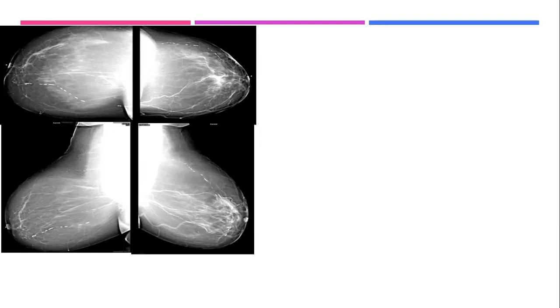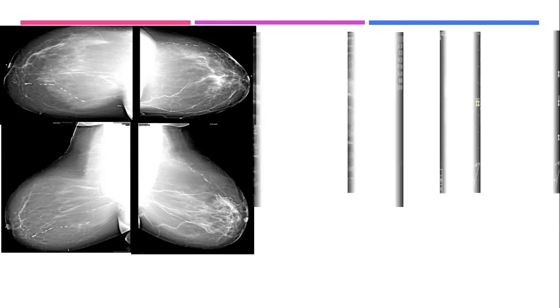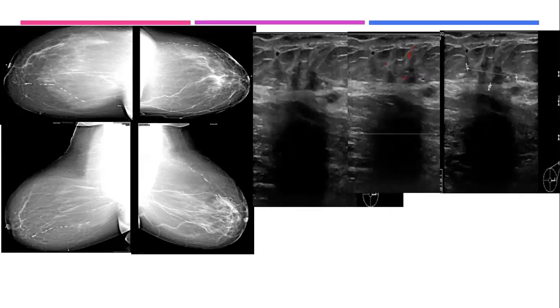The patient came, and I did this mammography for her. Usually we have technologists doing breast ultrasound. She told me the study is negative, nothing is there. Okay, and this is her ultrasound. Would you appreciate anything?